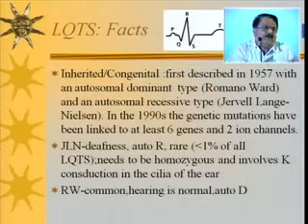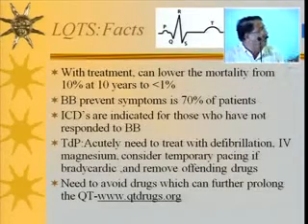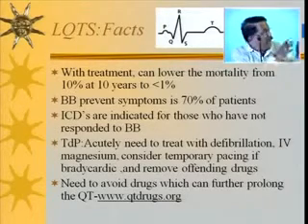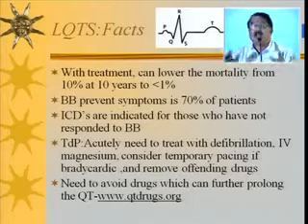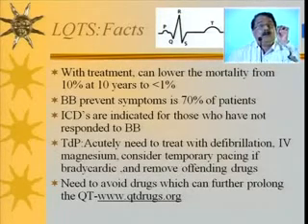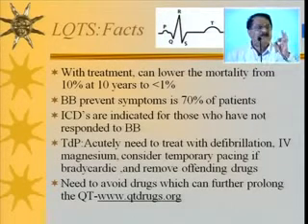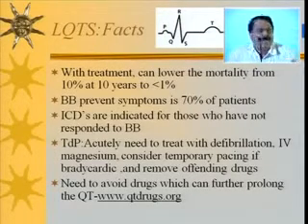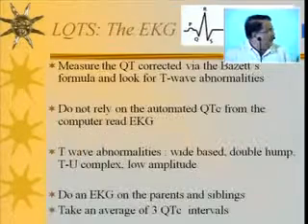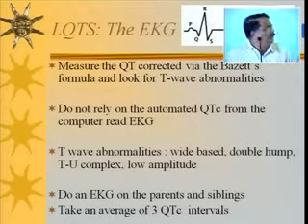But since in a given short 15 minutes of time for me, I thought it is better to give 2 case histories and show you the typical ECGs so that you can now detect in both the cases, Brugada as well as long QT. It is the physician's role to identify the case and execute what is to be done. Now your level is, now for congenital QT, what will I do?